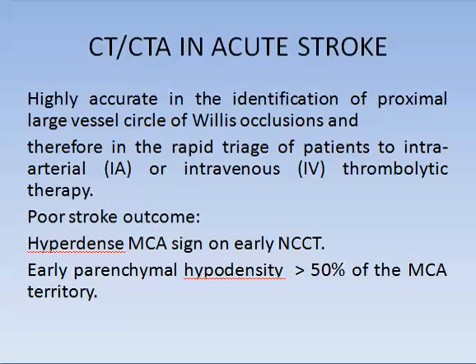So the non-contrast CT is important to identify the infarct, and CTA will sometimes be resorted to if the main vessel is occluded. It will present as a dense vessel.